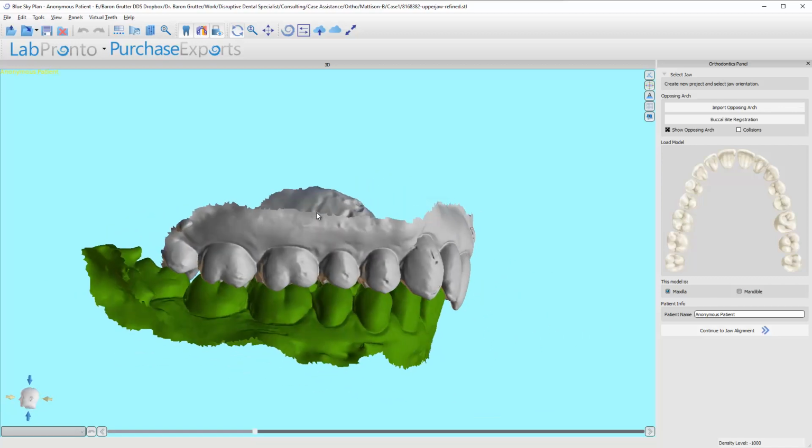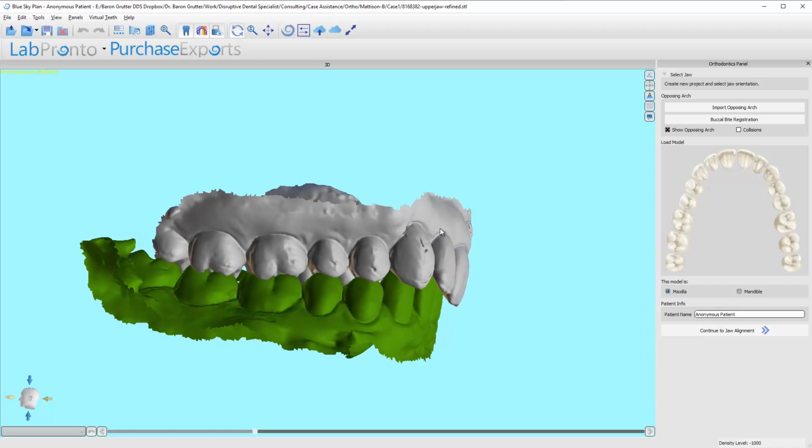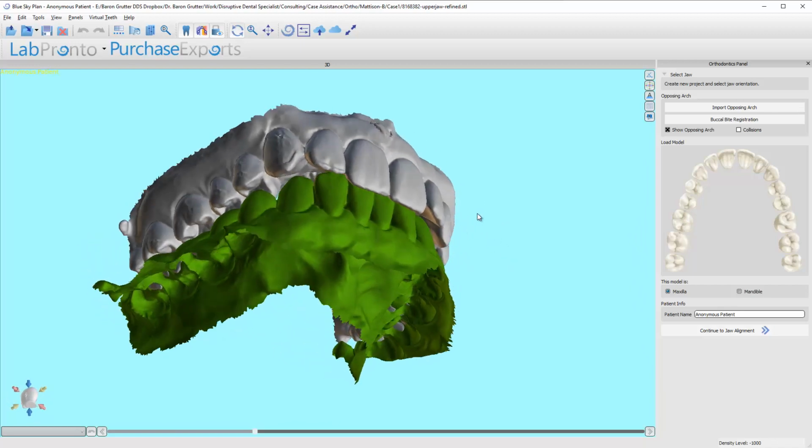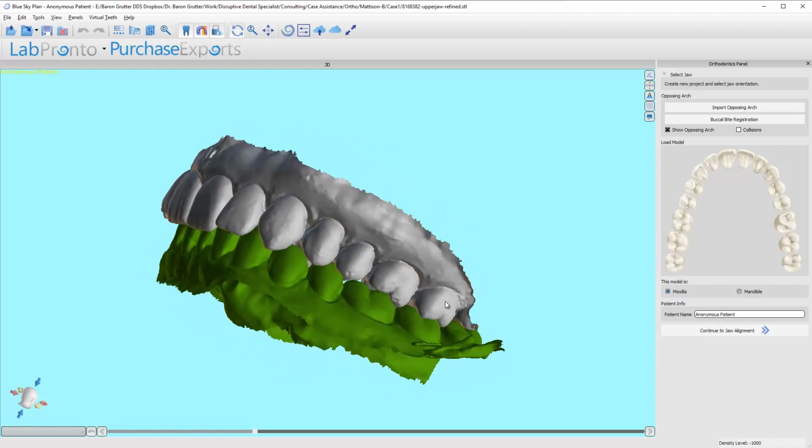And so now the software has all the models in. And this patient is pretty clearly class 2. So make sure you know that ahead of time and you discuss that with the patient. I may start their class 1 on the left side.